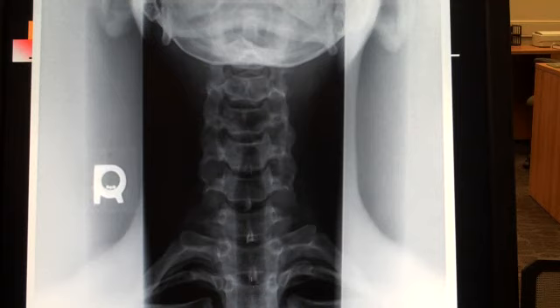Spinous process of T2 is right here. And we can see pedicles of T2 right here and here. This rib that is coming in right here, of course, it's articulating with the transverse process. And again, that's called the costotransverse joint. And then getting it to move into right here, this would be our costovertebral joint.